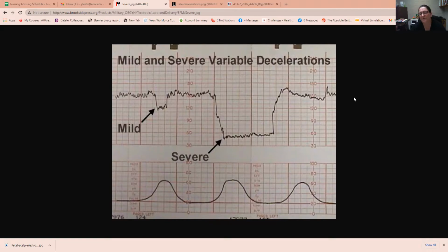Now, if you look right here, there's this little dip. I would like to see more of a pattern. If we're seeing this dip just after the next few contractions, that's a late decel, and it could be temporary. Sometimes after a big decel, we might see decreased variability and some lates for a few contractions. With this shortest strip, it's kind of hard to see, but it's possible that that might be a little bit of a late after that. This is still going to be a category 2 strip because we've got decent variability.